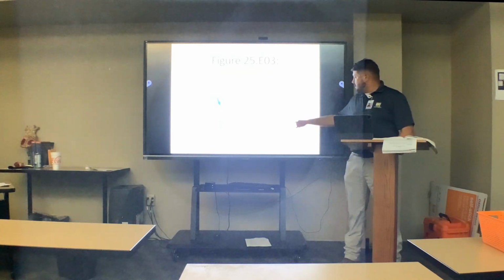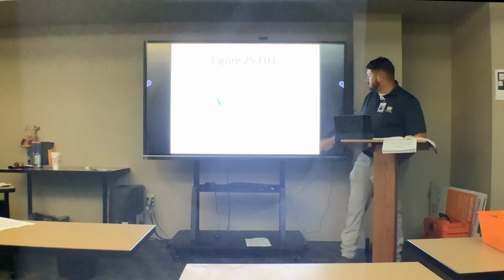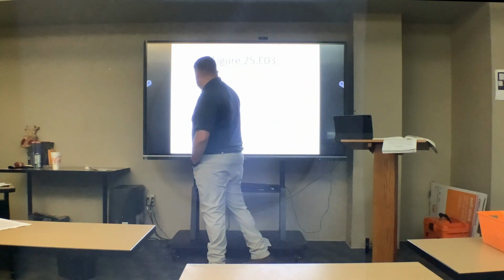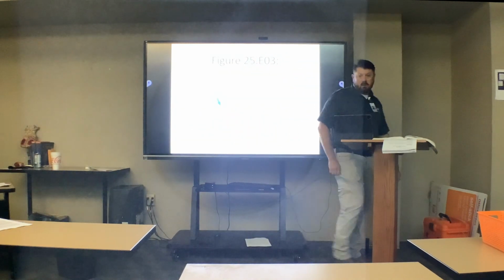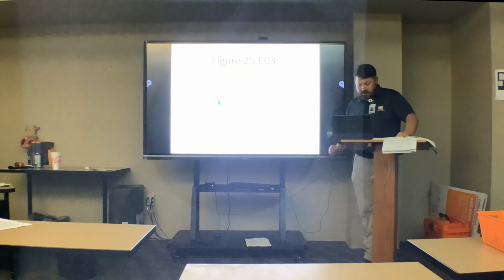This is an example of the pseudo R wave where it kind of notches right there, really fast rate. That's 180, but they didn't even give us a full thing, so it's probably over 200. And we could actually do an R to R to get it exact if we wanted to.